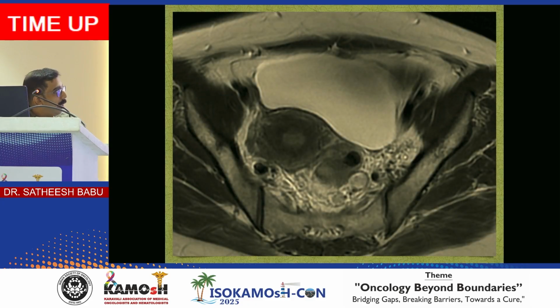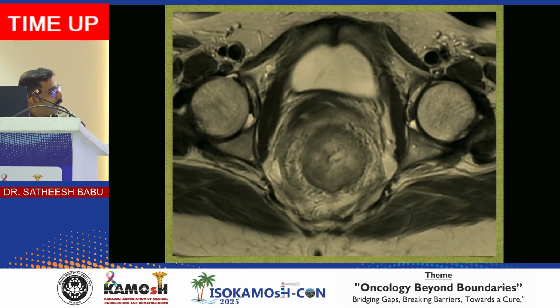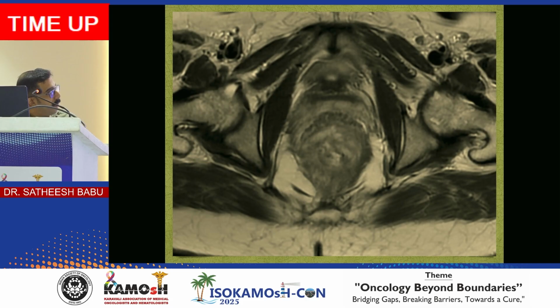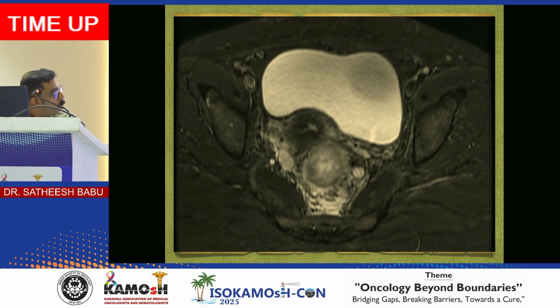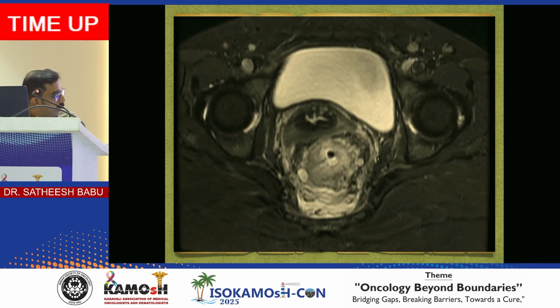multiple white lesions like that, usually should be gray. So these are mucinous nodes, which are better seen in... you can see the tumor itself is white, so there is mucin within the tumor. So these are better seen in fat suppression sequence. So you can see all these nodes which are white, whereas fat is suppressed in the fat suppression sequence. So this is one area where T2 fat suppression is useful.